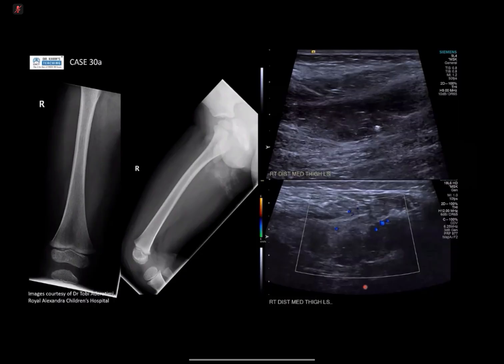Yeah. So hemangioma, as I said, is a vascular tumor. Okay, so this is not a hemangioma, but this is the other side. They are called vascular malformations. And I'll explain the difference in a bit. So you're right, these are phleboliths, and the reason why I gave the history is that they are usually just dysplastic vessels, okay? It can be lymphatic vessels, it can be venous vessels, or a mixture of venolymphatics.